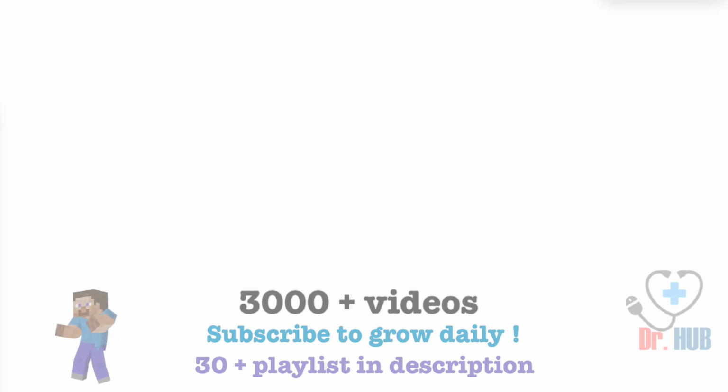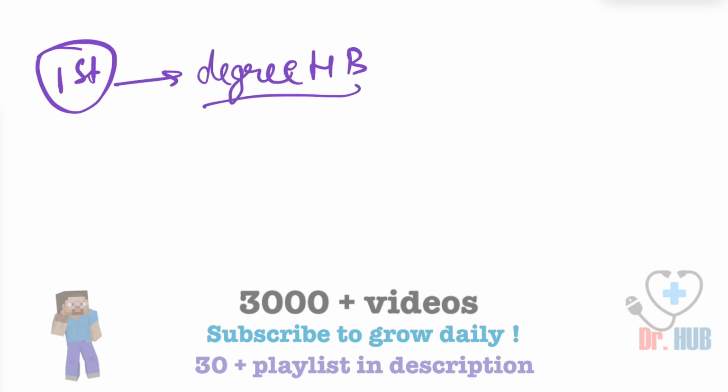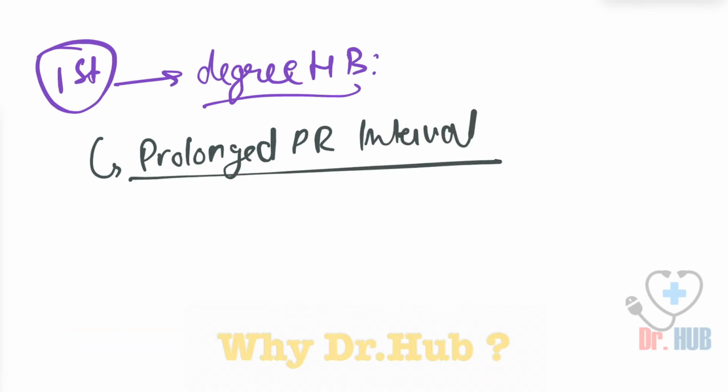To start with, firstly we are looking at the first degree heart block. In terms of the first degree heart block, the main characteristic is that there is a prolonged PR interval. This is very important. And what about the second?